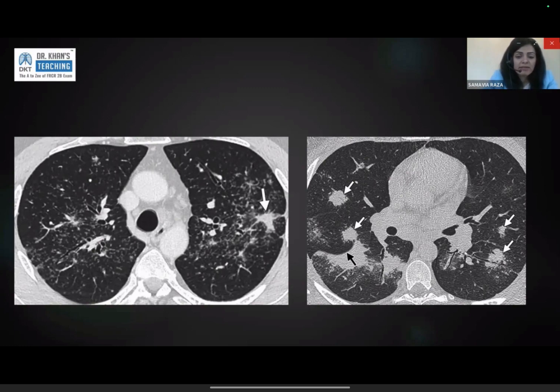If you have lymph node enlargement that is calcified and is stable, it's not called active disease. It's the parenchymal disease, the changes in the lung parenchyma, that determine whether that is active disease or not. The abnormality you're looking for is nodularity: nodularity of the fissures, nodularity of the bronchovascular bundles. When the nodularity is so advanced that there are a lot of small nodules sitting next to each other, they can coalesce together in what is traditionally called the galaxy sign. So it can look like a collection of nodules, and it can also look like one large nodule.